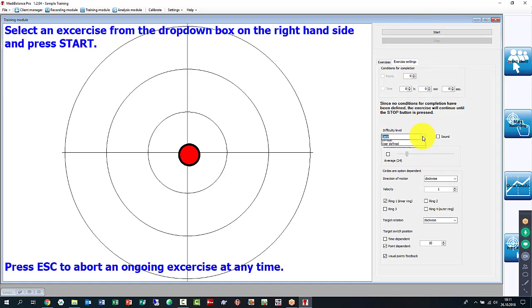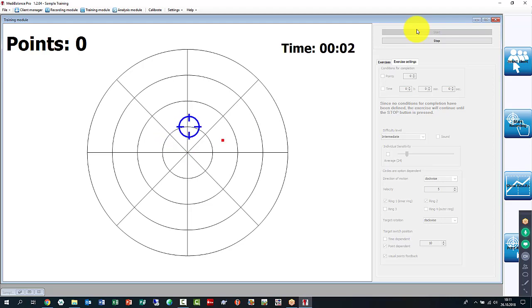So I'll go from easy to intermediate. For that one, I'll probably have to stand on the platform because else I will not succeed to stay inside the blue dot. So what you do is you try to follow it, which is already very challenging. And now it's even apparently faster, and now you do the same thing over in the outer module, and you can see that particularly if you're talking while you're doing it is a challenge in itself.